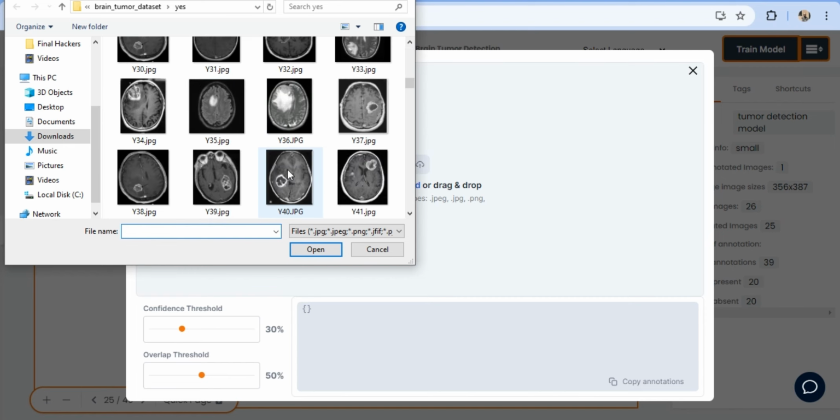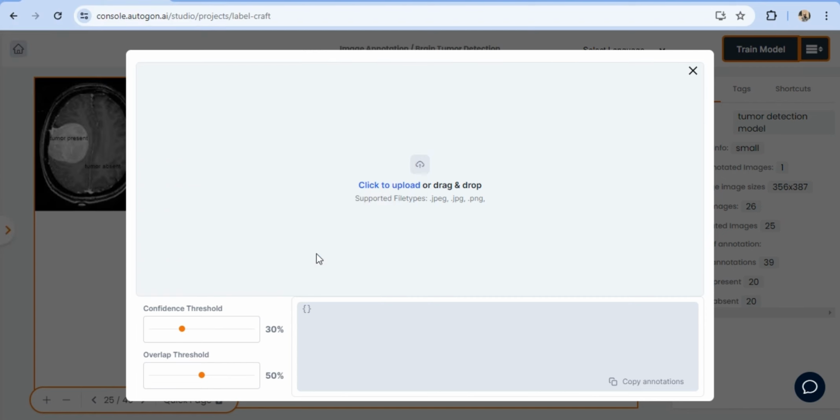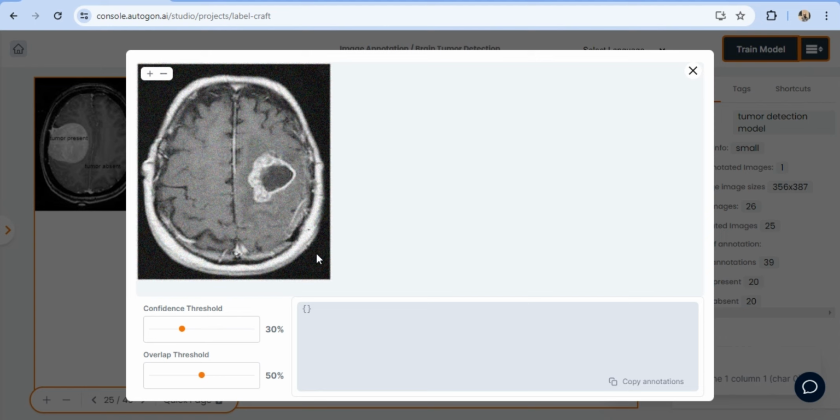Your confidence threshold is like saying you want to allow for a little more margin of error, something of that nature. This is just to show and detect all of this. But like I mentioned earlier, I didn't train this model with so many images, so that explains why the prediction is not happening. You don't want to make the mistake that I did.